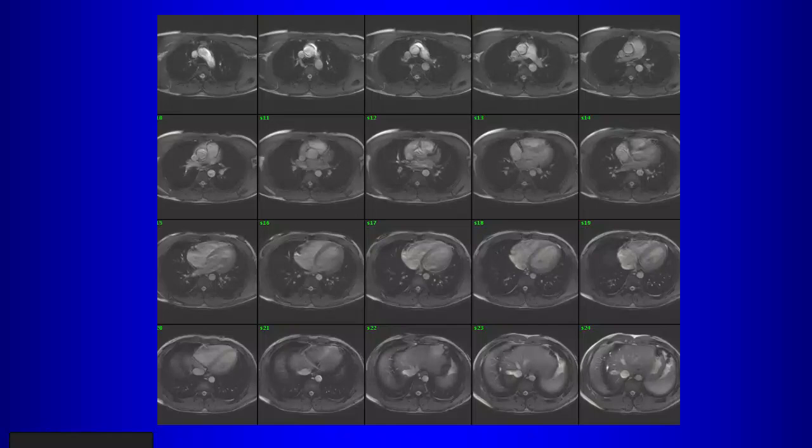So we talked about the cardiac gated, the Cine Fiestas, those cardiac gated imaging sequences that we use for cardiac motion. It's the same sequence, only we run it without cardiac gating. So if you run this without cardiac gating, you can obtain a whole series of images very rapidly, right? So it's that same balanced gradient echo sequence, only we run it without cardiac gating. So you get the whole chest in axial images.